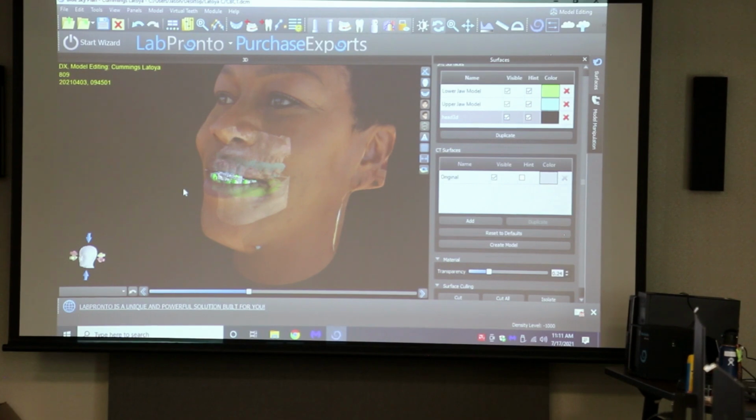And also, in those surface cases go to model manipulation on the far right. You can always compare it to a physical location. Go up here and select the head. Right here, and then it'll be on the head, right? Just on the upper jaw. So click on that. That is a good way. On the upper jaw model, you're gonna select which model you want. Now click on the head. Using some of those landmarks on the face. And then, yeah, so there you go.